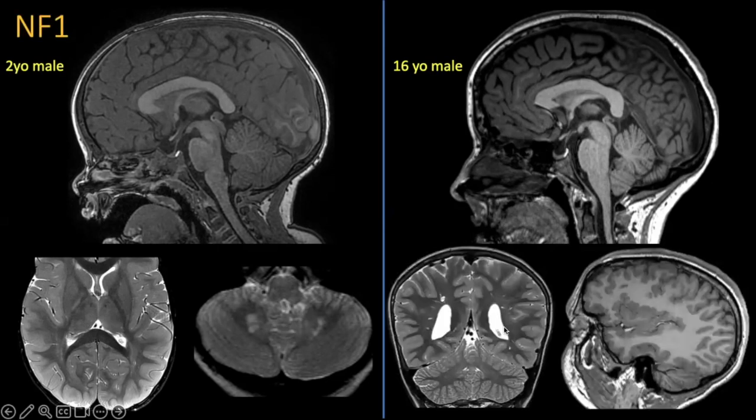And on the right, we have enlarged perivascular spaces and perisylvian and frontoinsular polymicrogyria. You can see the gyral sulcal pattern is quite increased in these regions compared to the more normal gyral pattern more posteriorly in the hemispheres here. So this is a case of a PTEN mutation, which is a regulator of cell division and tumor suppressor gene.